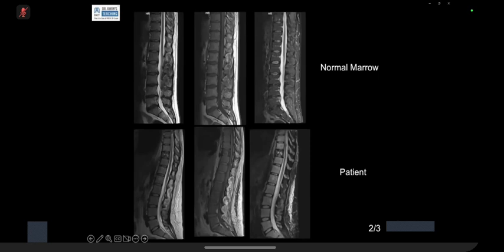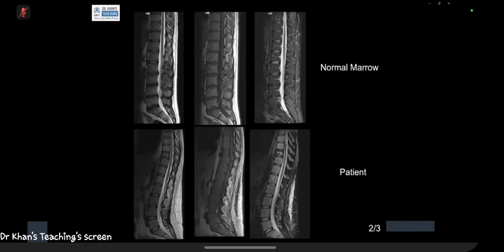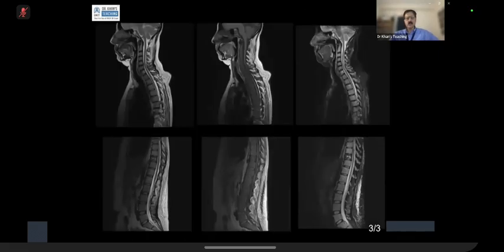Another thing, I have not put slides here for myelofibrosis, where on a T1 weighted sequence it will be low signal. On STIR also, it will be low signal in myelofibrosis or myelosclerosis. And in some of the sclerotic mets, particularly prostatic mets, which are diffusely high density on a CT scan, it might be low signal on STIR, and that is then better diagnosed on bone scan. But that's a different subject. That was not my aim today.